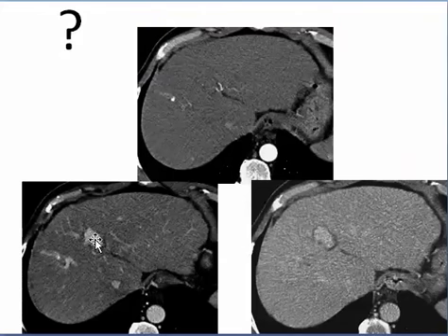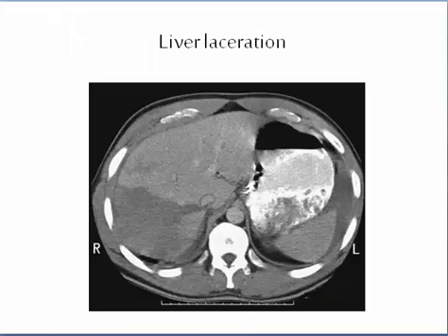Another one, post-biopsy fistula. This is a case of liver laceration with fluid accumulating within the peritoneum, intraperitoneal fluid collection.